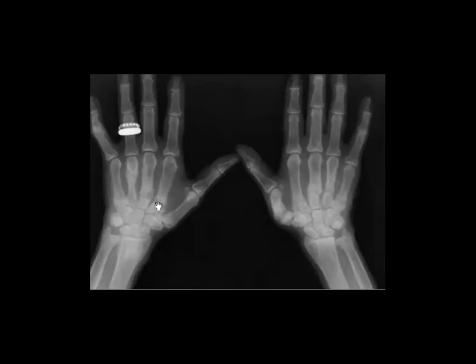So it's good when you describe this case, you show that this is the mature skeleton, or the X-ray of a skeletal mature patient, yeah. And it affects the mineralization, right? Mineralization of the osteoid, we mentioned this before. The main cause is vitamin D deficiency, yeah.